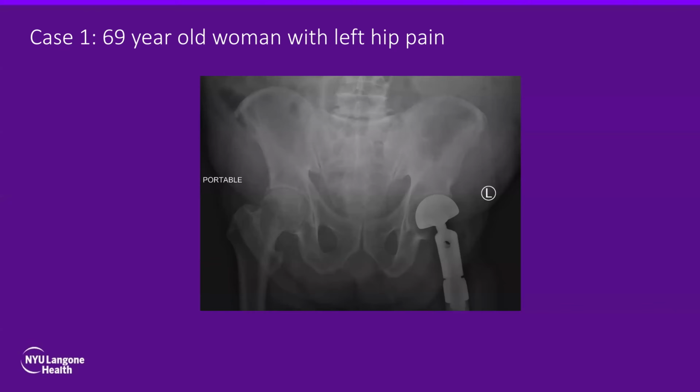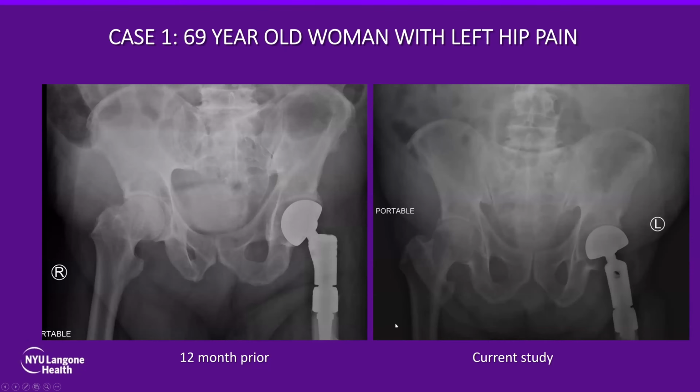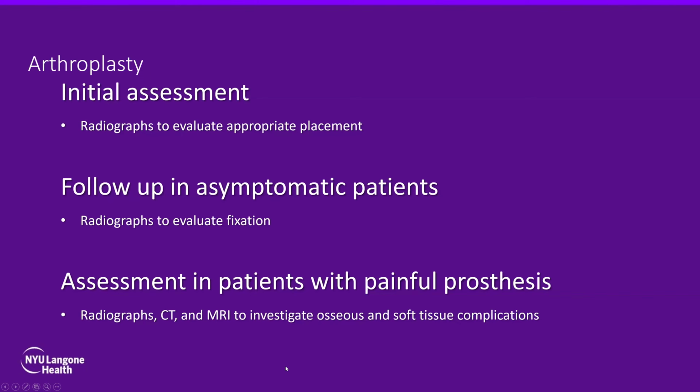So this is a patient with left-sided hip pain. Obviously, we see arthroplasty, and rule number one in radiology is: is there a prior? And yes, there is a prior, and this is 12 months prior. Look at the arthroplasty and see what you think. Okay. So I'm going to go through different configurations of the arthroplasty, and then we'll come back and revisit this case again.